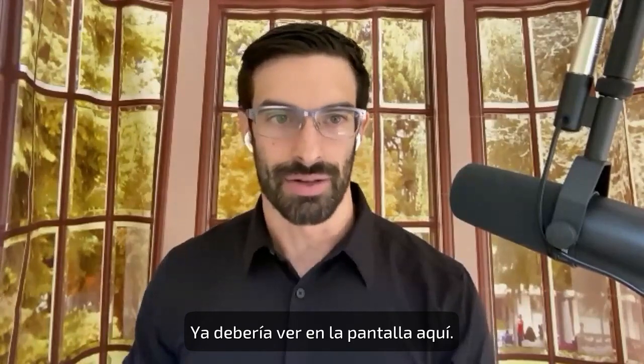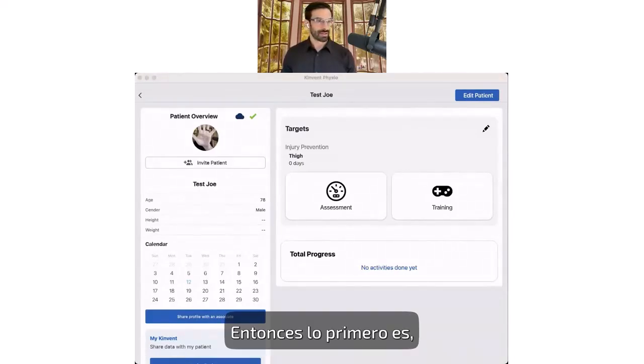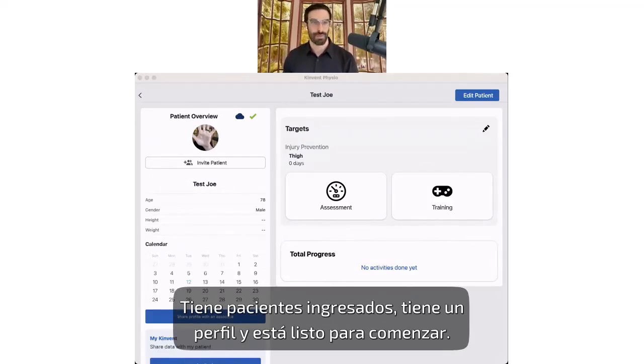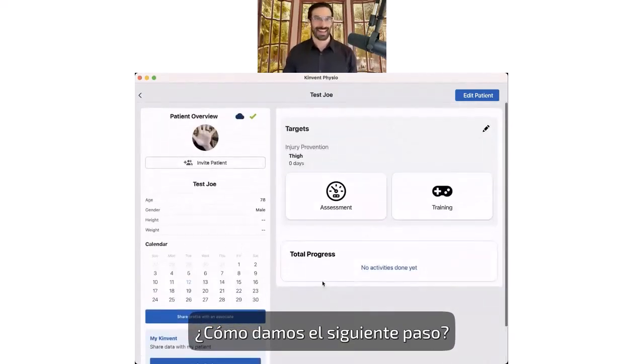And now you should see on the screen here. And I'll go step by step through these different processes. So the first thing is you've now done all the onboarding to get the technology set up. You have patients logged in, you have a profile, you're ready to go. Well, how do we figure out different protocols? How do we know what to test? How do we take the next step?